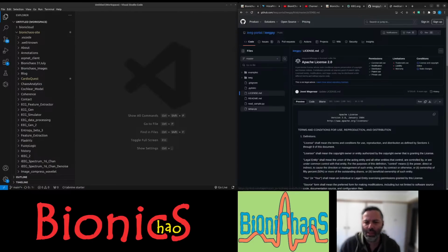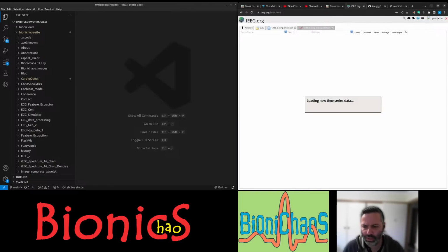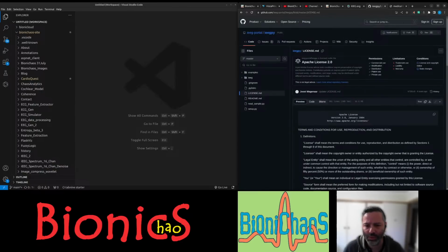Did it load anything? No, it's still loading. So yeah, you can tell it's a bit of a useless interface there. I'm not sure what it's doing. Is it too large, or is it still loading? Did it stop? Don't know.